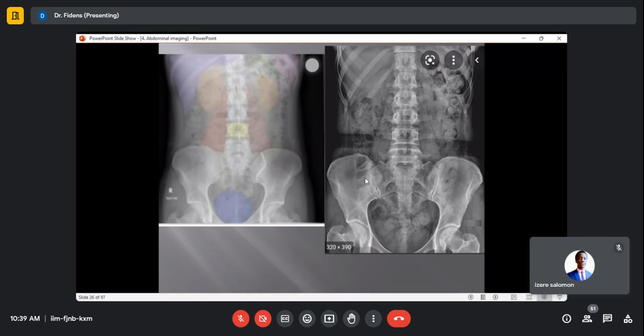For this patient, there was a lot of fecal material. Too much fecal material in the colon is a sign of chronic constipation. Okay, do you understand how we approach the interpretation of plain abdominal X-ray? Remember, chest radiography is a bit different. Ask, please.